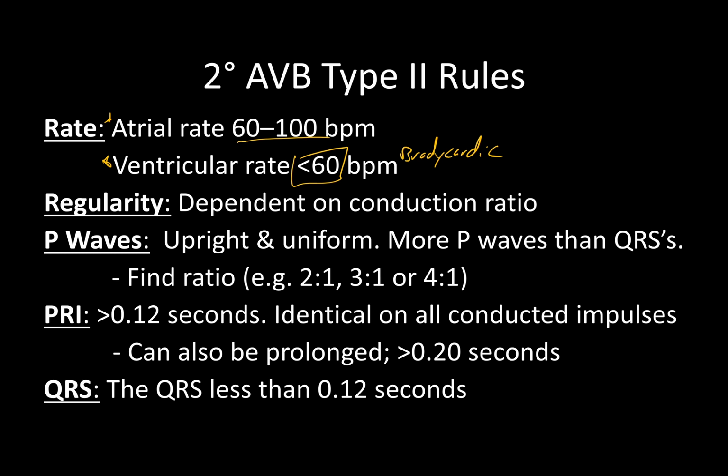That's kind of the big focus there. As for your regularity, it really just depends on the conduction that's occurring. Sometimes it is perfectly regular, other times it is quite irregular. It just depends on the person or the strip that you're looking at, because people can change throughout a shift. I've definitely seen that more than once in my time.